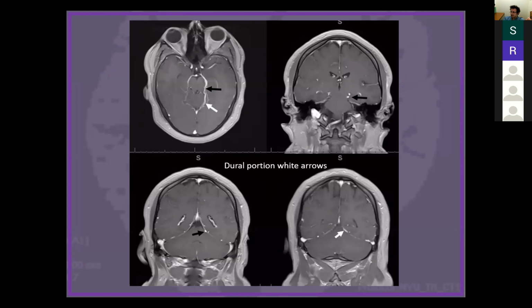This is the MRI of the same person. And when you look at the MR, it's easy to appreciate how that happens. The black arrow again points to that mesencephalic segment. So that's the basal vein per se. And then the white arrow, when you look at that, you see how this is a little bit thicker right here. Here is, again, the black arrow in the coronal view. Here's the tentorium, right? This vein is running right next to the tentorium, but it's round. Now here you see how it becomes flat, right? At that point, that's the tentorial sinus, the typical flattened appearance.